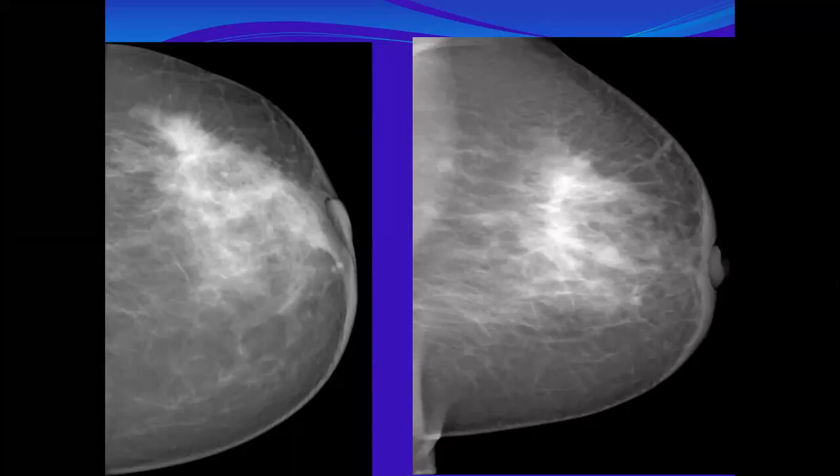Okay. So you describe it as in craniocaudal. I describe it as a spiculated mass because it obviously has spicules. So this can be distortions. Yes. It depends. You might say this is the mass. But if you look at this, what about this? This is part of the mass. All are abnormal. This is area.